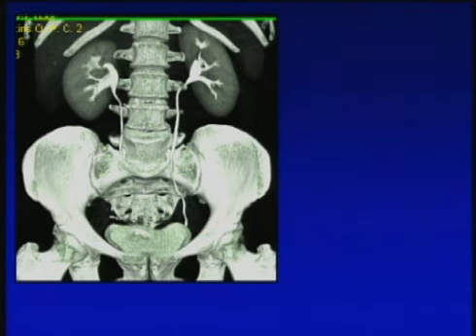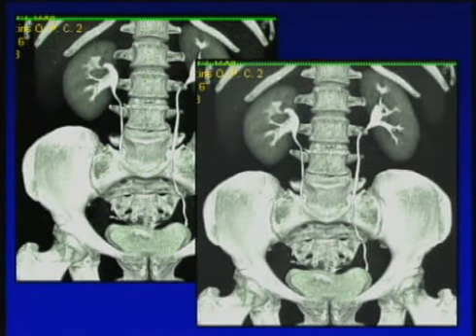So in our practice, we routinely will do that and send those images to the urologist. In terms of protocols, we'll talk about that a bit later, but in about 90% of cases, you're able to opacify well the renal pelvis and proximal 2/3 of the ureter, and the lower 1/3 in about 70% of cases. Even in patients with obstruction, of course, you can see the ureter because it's dilated, and water or urine makes a great contrast agent as well.